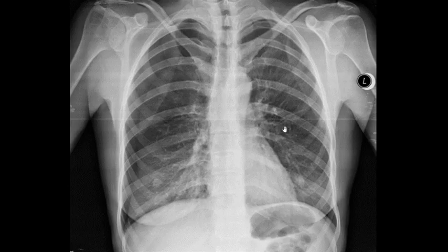And we see that from the hilum, these small little whitish streaks are actually the vascular markings of the lung, the vasculature of the lung. And they go all the way from the center, from the hilum, all the way to the periphery. Maybe it is hard to see here, but once you look at X-ray images, you will see, if you look close enough, that even on the whole periphery of the lung, there are small whitish markings that represent these vascular markings. And it is always important to look for them and to see if they're present all the way from the basal part to the apical part.